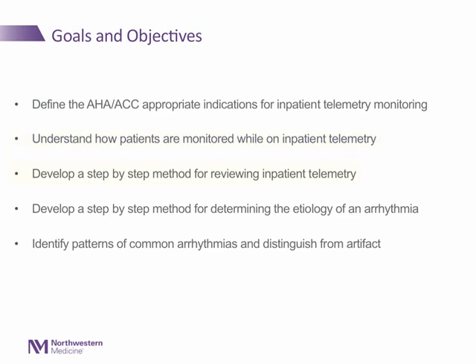The main focus will be to help the viewer develop a step-by-step method for comprehensively evaluating telemetry to identify clinically significant events. Furthermore, the viewer will also develop a step-by-step method for determining the etiology of an arrhythmia when one is identified. Finally, the viewer will review patterns of common arrhythmias and learn to distinguish a true arrhythmia from telemetry artifact.